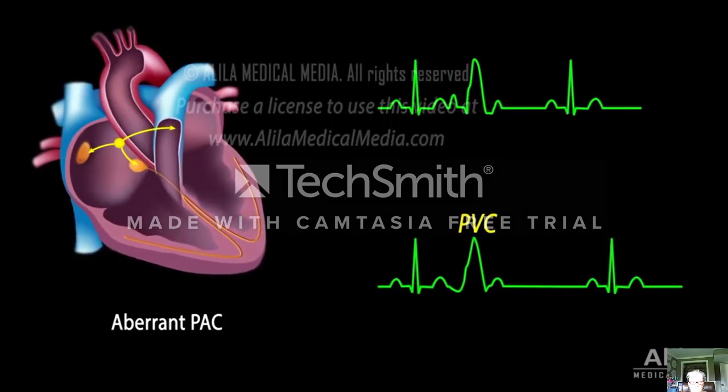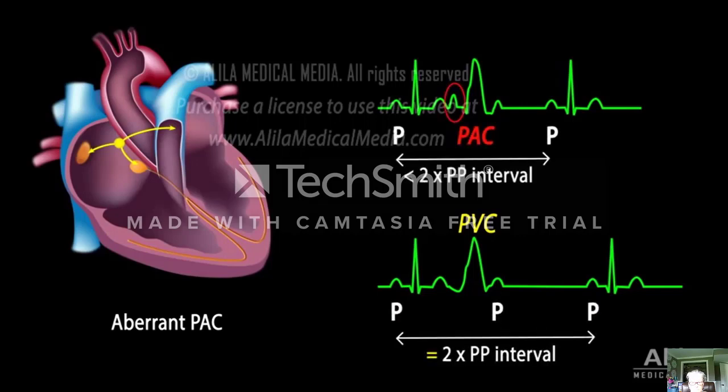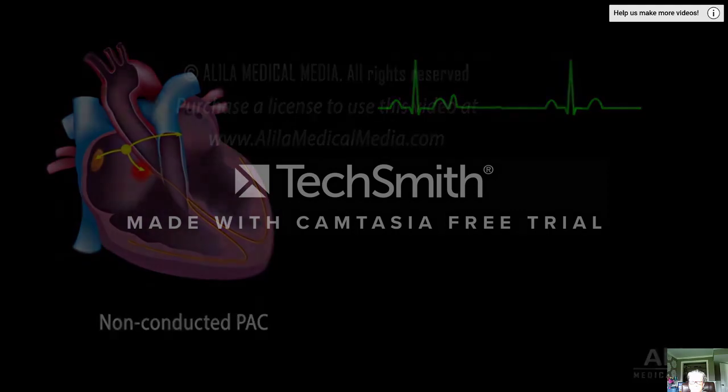In this case, differentiation is made based on the presence of a preceding P wave and a non-compensatory pause in PAC. A non-conducted PAC is one that arrives too early to the AV node, at the time when the AV node is still in refractory period and thus cannot be activated.